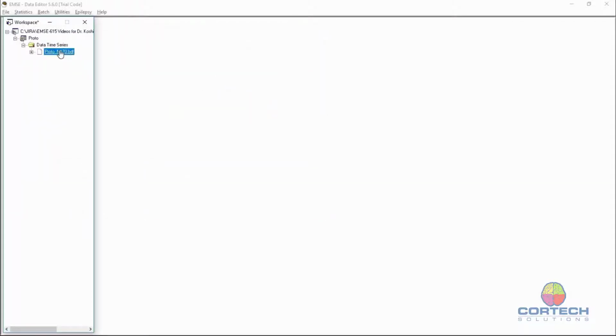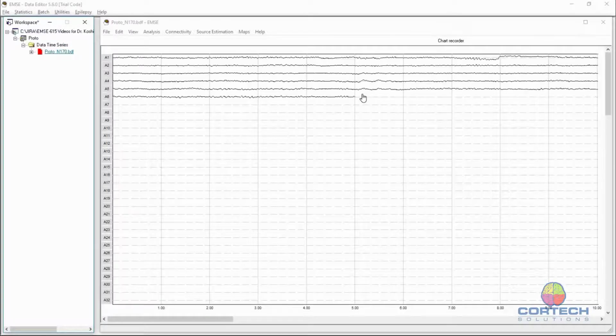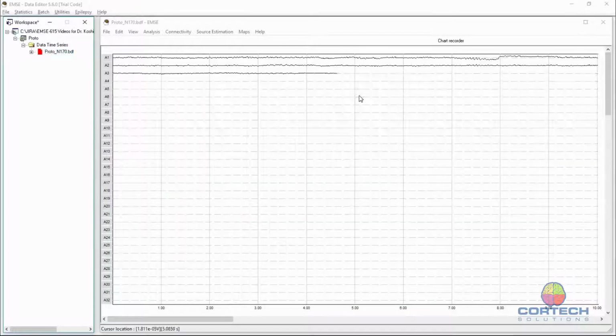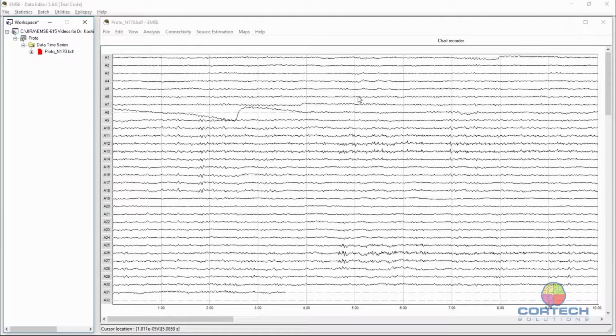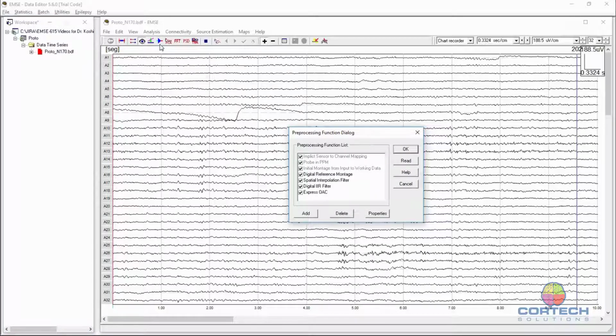I'm going to double click on this. This is a small file, and principally we want it now because it has attached to it the filter pipeline that we want to apply. So in particular, it has a probe. This probe, we can look at it.